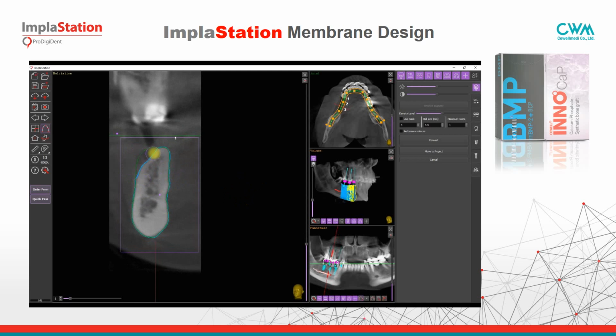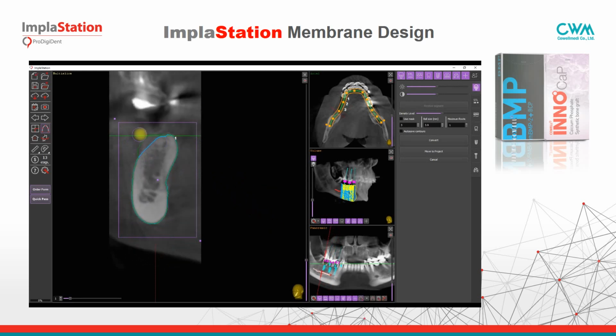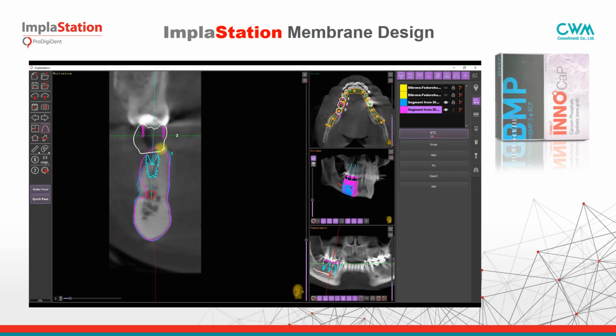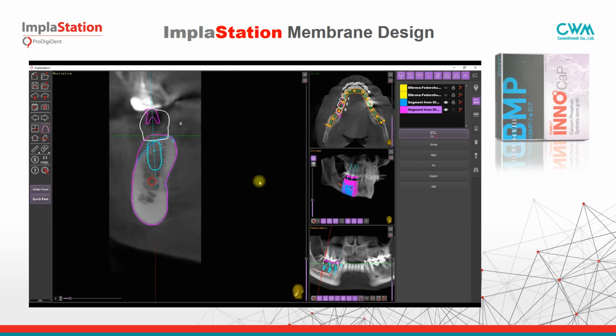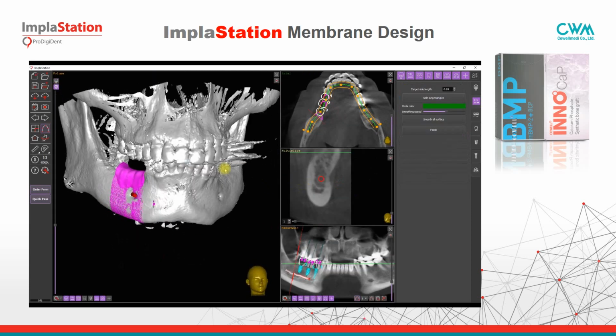After creation of this desirable bone shape, there are some options. It's possible to print the desirable bone and adapt a titanium mesh, or we can create a file of a hard body membrane for 3D printing from titanium, or we can subtract the existing bone shape from the desirable bone shape and receive the file of the bone block we'd like to attach for this certain case.